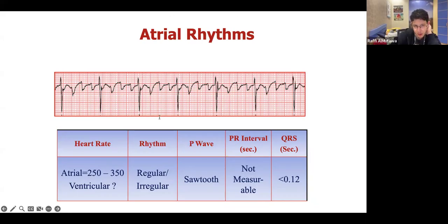Okay, so someone said a word I like to hear. Any other guesses, chat? Okay, nice. So, yeah, this is atrial flutter. How did we come to this conclusion? Sometimes it's literally going to be right in your face. You're going to see the sawtooth pattern. If it's right there in your face, don't overthink it. Monkey see, monkey do. That's my philosophy with tachycardias and life, honestly.